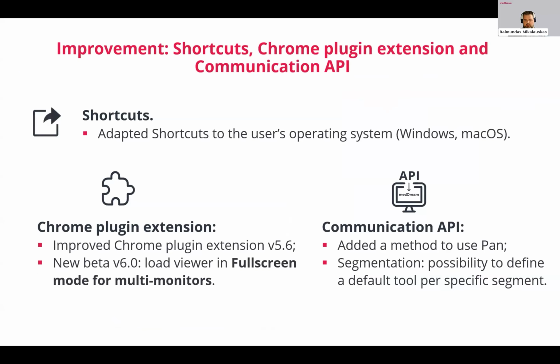Shortcuts. We improved them to work with Windows and macOS systems, because as you know, macOS has some limitations on the buttons and other things, so now we expanded the functionality and cover both operating systems.